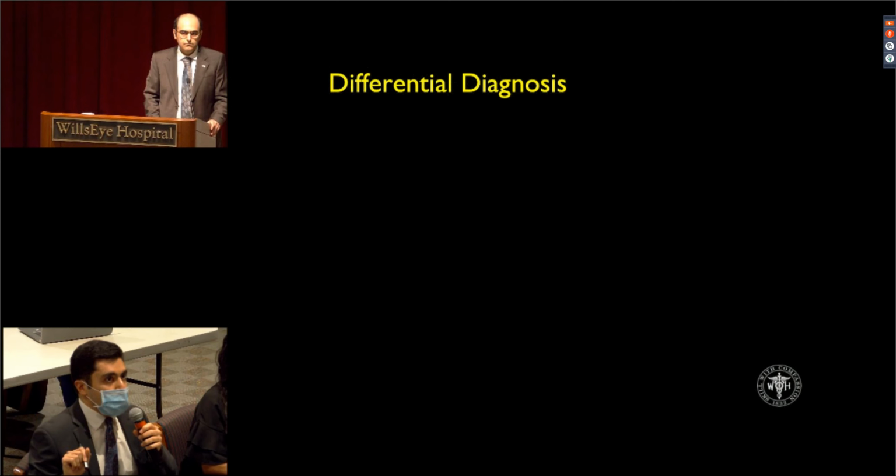Other inflammatory causes I would be thinking about in this case, some of the white dot syndromes, AMPPE. It's pretty monofocal for AMPPE, but we could have confluent forms appearing similar to this. With that peripapillary involvement, serpiginous also comes to mind, another reason to do the Quantiferon Gold testing. And within that spectrum, ampiginous would also be on the differential here.